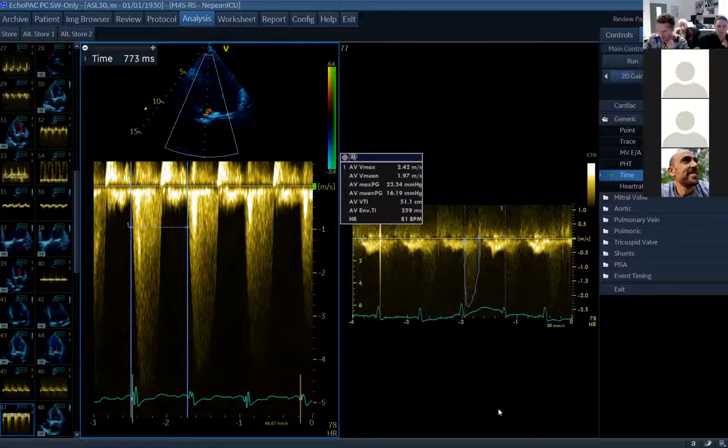What if you're struggling to differentiate the two, though? I think it would be trying to take a picture of both, getting the MR from different angles, and then comparing the start time if you've got two different traces. That's sort of the best I can do. So you've got to try and find separate traces, and then you'd know that the later one was definitely the aortic flow.